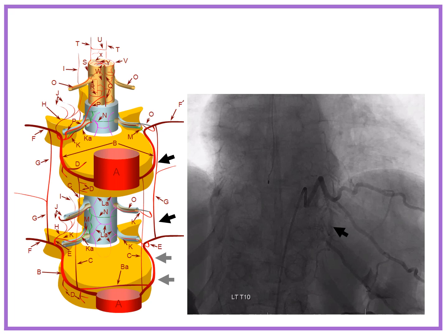Now, if you look at this picture, you start to see a funny thing. Normally we say, well, this is a conjoined thing, we don't have to look for the left T9, we don't have to look for the left T11 because it's already supplied through the left T10. The answer is no, that's not how it is, because this only supplies the back. What supplies the front of the vertebral body? Well, that is not coming from the left T10, so the left T9 and the left T11 vertebral bodies still have to have some sort of supply. The left hemibodies anteriorly still have to have something.